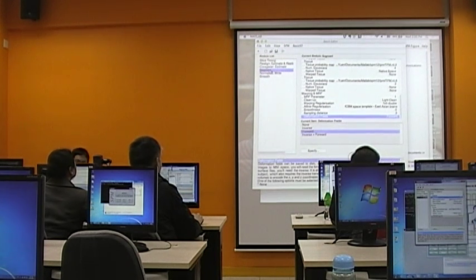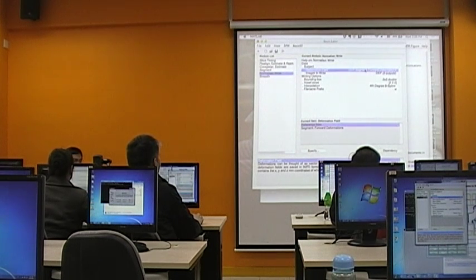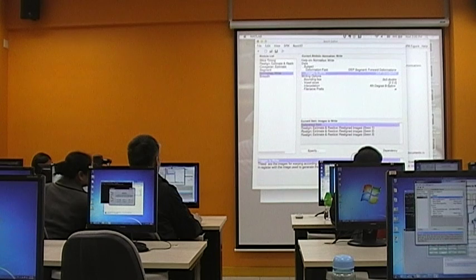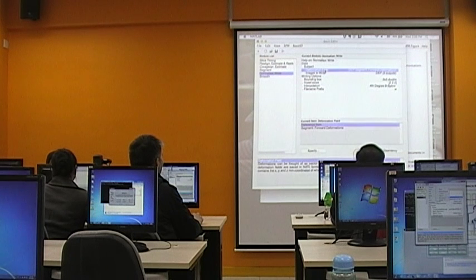And so now after this step, the T1 should be segmented, and then you could simply apply this deformation field, which is the normalization parameters, to the images of both fMRI signal. Okay, so here both of them are dependencies because we do have an output after realignment, because we have corrected from head motion, then now I want to simply put them into an algorithm for the normalization. And then the deformation field, as I said, you could bring it from the last step.